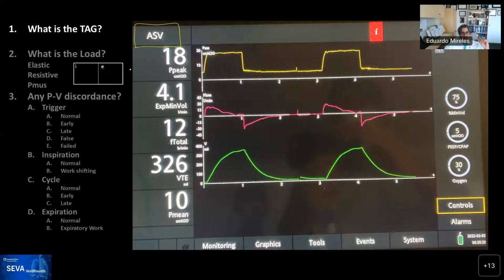All right, I'm starting to see more and more responses, but again, what you see is people are choosing PC, and that's the right attempt. Actually, in this case, this is a beautiful example that if you look at the pressure control waveform, it's a beautiful pressure control waveform. And then you look at the flow waveform and it looks like, I don't know, a really bad ride down a slide with some humps and bumps in between. And so what you're controlling is actually the pressure, and the flow is dependent on the respiratory system characteristics.